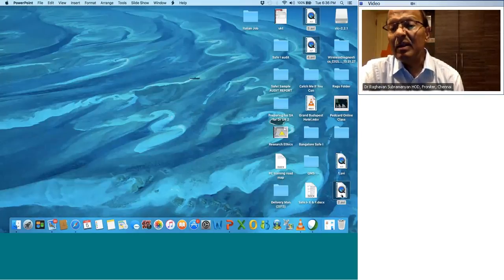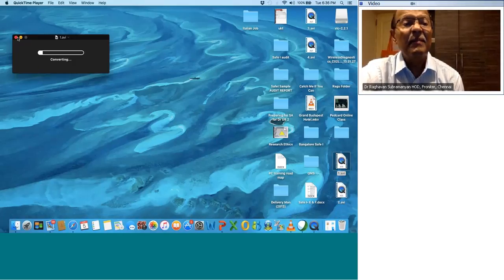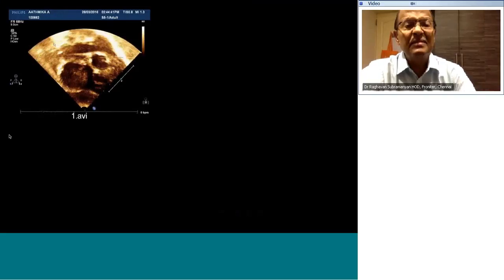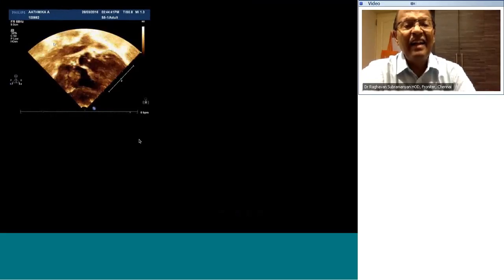Have a look at this echo recording and tell me what you see. I don't know why you're not seeing the angio there on the screen. One second. Can you see it now? Can you see the image?